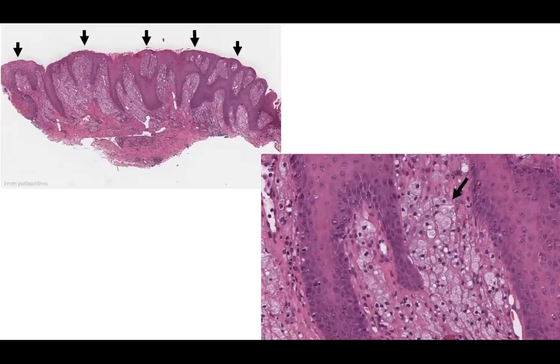Take a look at this lesion. It's a shave biopsy. You can pause your video and put together your differential diagnosis of what you're looking at. And after thinking about it, you may notice that there is a verrucous-looking architecture to the lesion at low power. The stratum corneum appears to have areas of eosinophilic V-shaped stratum corneum with some parakeratosis. On higher power, the main cell that you need to observe are these foamy histiocytes. So what's your diagnosis?